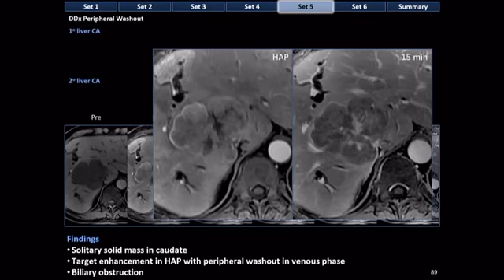Okay, but what's the differential diagnosis for this? The differential diagnosis for this is ICC or hepatocholangiocarcinoma. Very rarely an HCC might have this appearance. There are some scirrhous HCCs, very fibrotic HCCs that will retain contrast in their center, but those are quite rare. Or this could be a metastasis to the liver. So let's look at this differential. ICC, hepatocholangiocarcinoma, HCC, or metastatic disease.